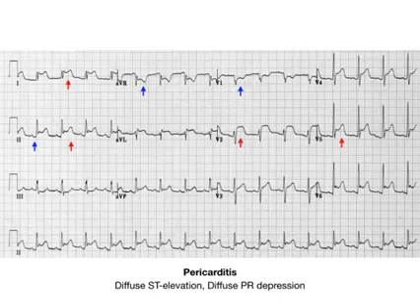The red arrows are showing you diffuse ST segment elevation. Now you might look at this at first and be like, oh, is this a STEMI? I see ST segment elevation. And that could be possible, but what you need to appreciate is that the ST segment is diffusely elevated in all of the leads. And of course, it'd be very rare to have a STEMI in every single lead at once. You wouldn't be infarcting all of the vessels of your heart at once. So this is probably pericarditis.